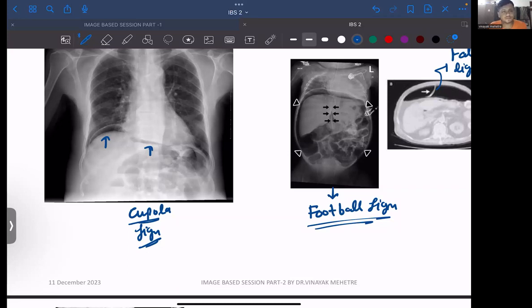अब same question. Patient presented with fever, vomiting, pain abdomen, unable to detect appendix on ultrasound, but X-ray has been done. क्या किया हमने? X-ray has been done. ये दे दिया X-ray तुम्हें. X-ray has been done and there is decrease in BP as well. What is the treatment? आंसर बदल गया, सिनेरियो पूरा चेंज हो गया.